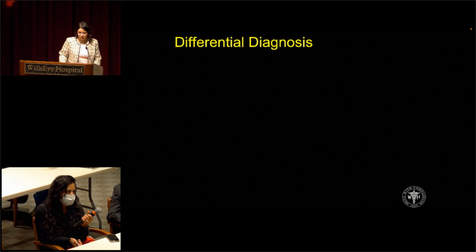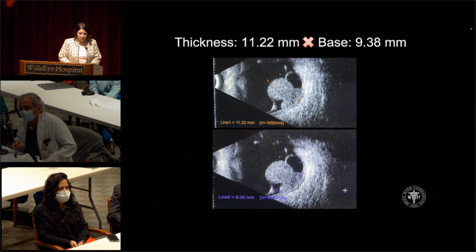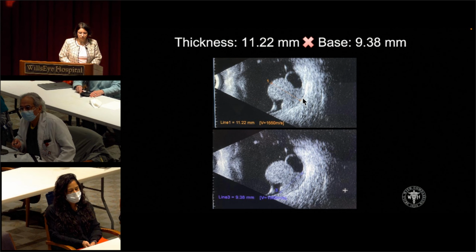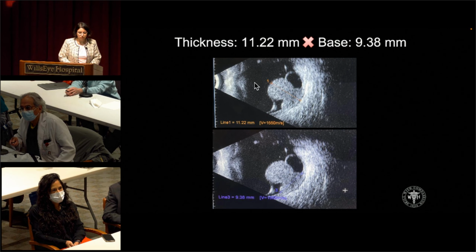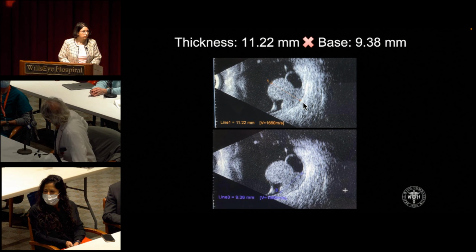And what are the broad differentials based on the mushroom mass? Can you go back to that last picture? And I want to ask Dr. Shields, in the COMS, the tumor had to be directly across from the pupil to get a true measurement. And measurements that are off axis are abnormally long. What is your feeling about doing them on axis versus off axis?